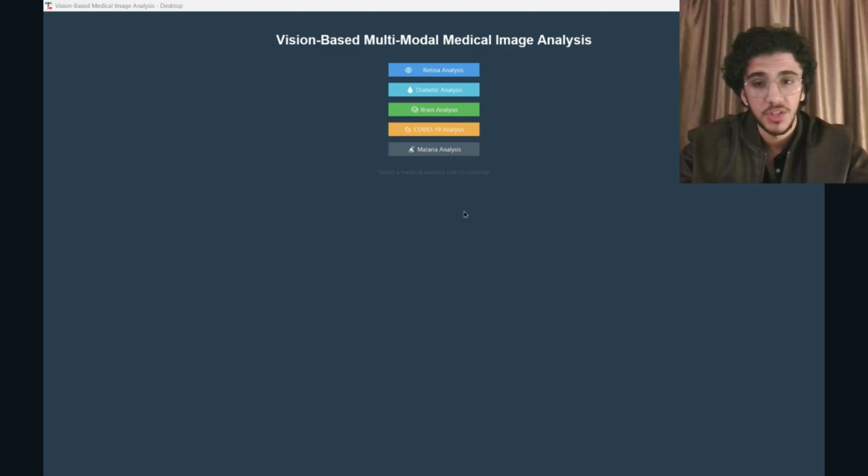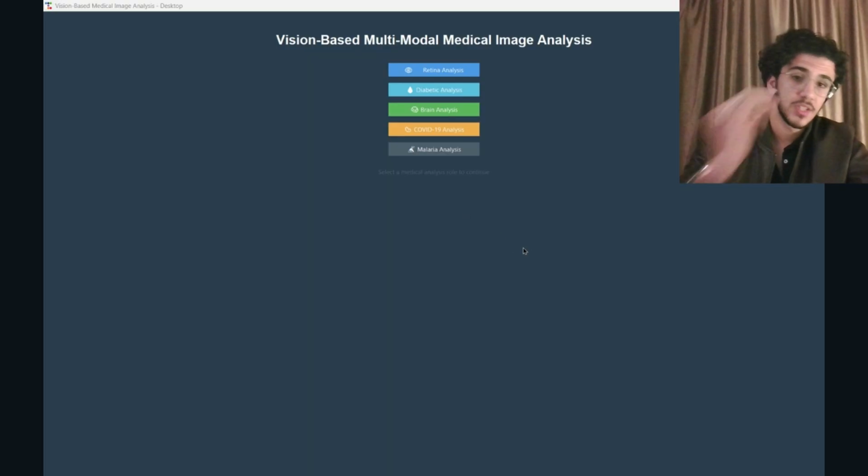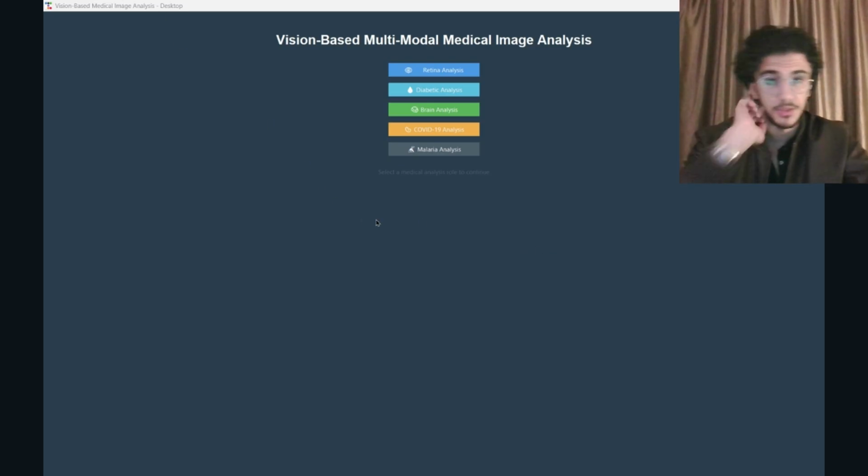My new machine vision is a traditional pipeline that enhances the image, extracts vessels, detects exudates, hemorrhages, and even estimates the fungal infection likelihood. This provides quantitative measures like vessel density and lesion counts, which complement the AI prediction. So let's start.